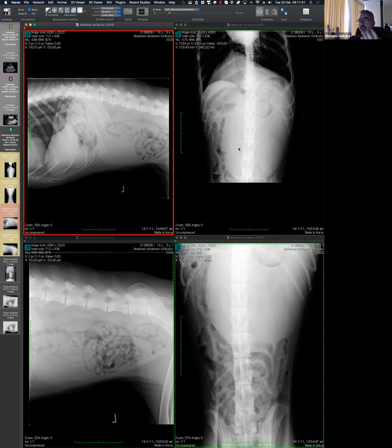Yeah, so two situations. And again, perfectly thinking aloud, because just making the connection without explicitly saying why is kind of poor. What we are doing is perfect. So you see the kidney. How are you going to use that information? Well, if you see the kidney, it means a couple of things. First, that the mass is not coming from the kidney. Makes sense? Because otherwise, you should not be able to see a normal kidney. You should be able to see an abnormal kidney. So if you see the mass and the kidney, it means first that it's not coming from the kidney, or at least it has a very weird shape.